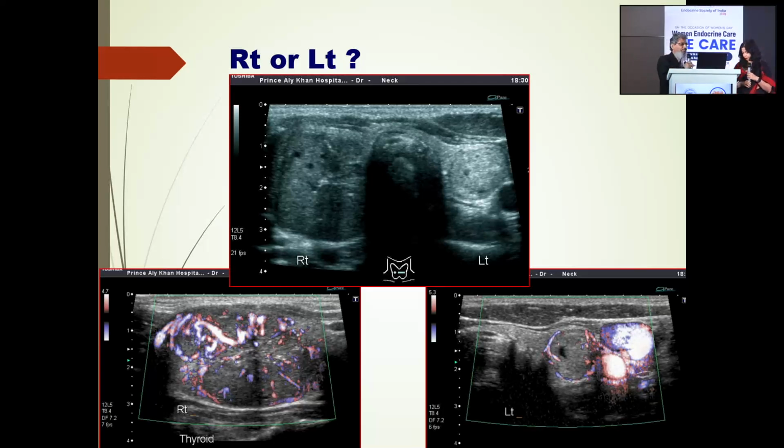So I think this is just a simple exercise, even for those who do not practice ultrasound and don't see it regularly. Anybody in the audience would like to comment on just this? Simply take, yeah, which would be abnormal here. Anybody can tell which is abnormal, the right one or the left one? You can take a wild guess. Take a wild guess, it's okay. We are not all radiologists, sir is a radiologist. But we can take a wild guess. Which one is more abnormal?